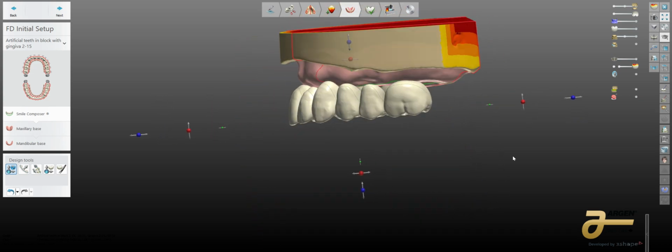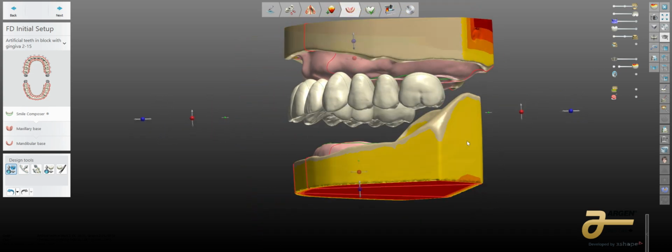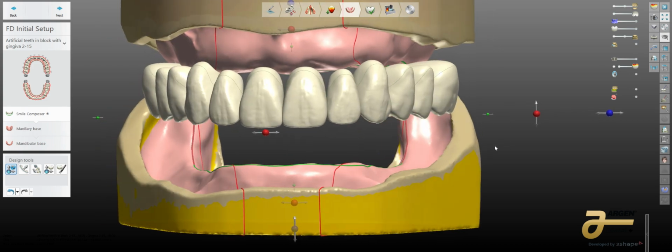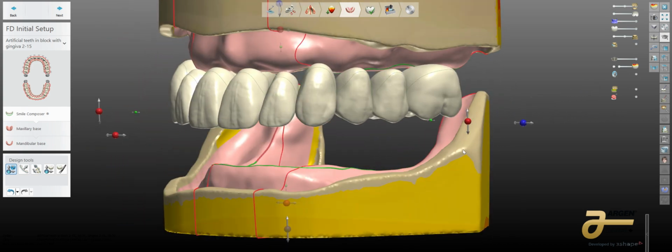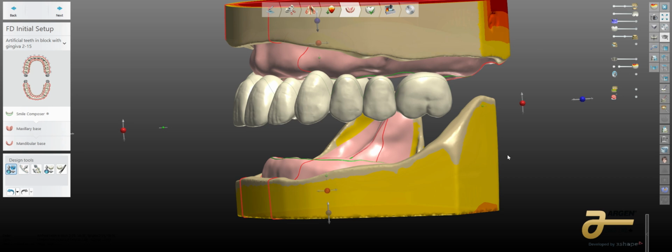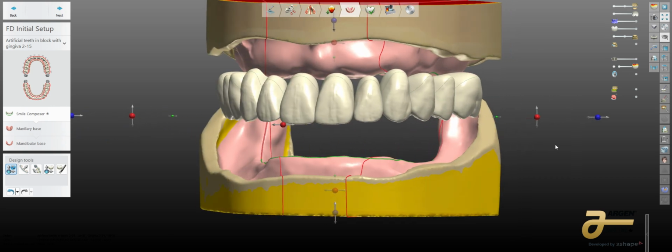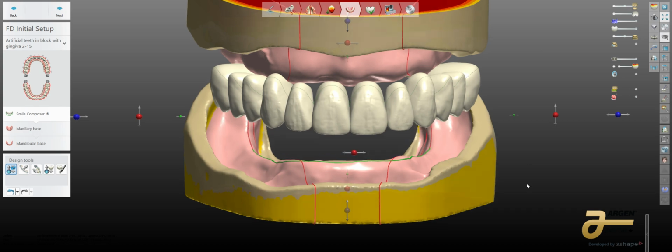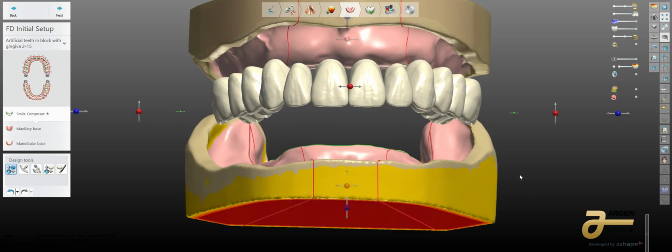All right? That's pretty nice to be able to get to this position. A couple really powerful tools to put in your arsenal is the height of the retromolar pad in relation to the terminal tooth that's going to be there. Generally, a safe bet is 3/4 of the height of the retromolar pad. We're going to try to set the teeth on the crest of the ridge as much as possible.